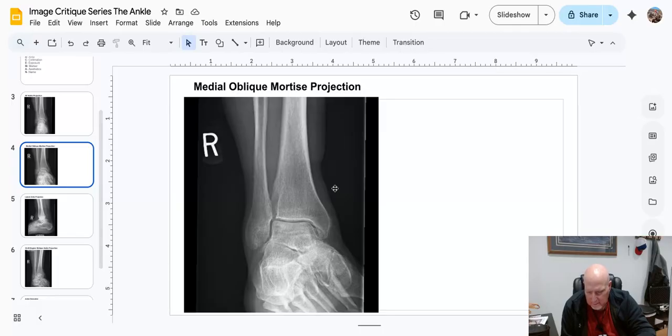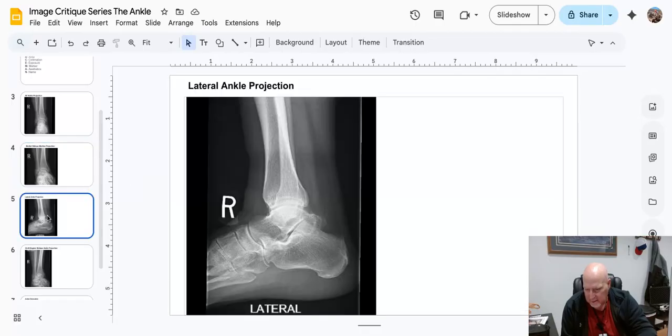There is a fair amount of arthritis in this joint, noted by the light outlines. You'll note that especially on the fibula right here, we've got some wavy edges to the bone that can indicate some arthritis or some age. So we've got a right marker. It's placed in the correct position on the lateral side of the affected joint. And aesthetically, I don't see any artifacts at all. It's a nice picture. So here we've got the lateral.